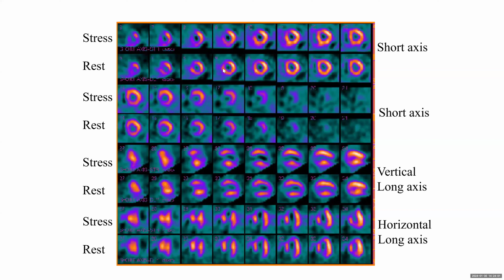You can see the septum here. How is it really enhancing? And on the rest, while on stress, it's actually defect. It goes from the septum in the distal or apex, going up the way. It's actually improving in perfusion, as well as start to improve in the perfusion in these segments of the anterior wall. It's also improving in the mid segments.